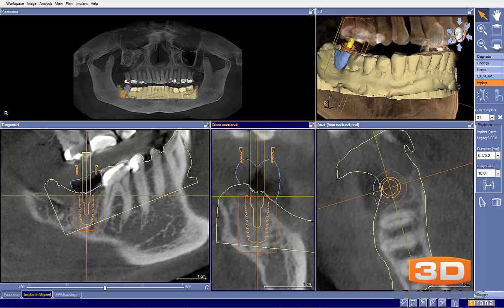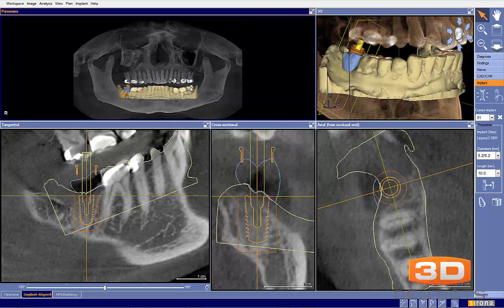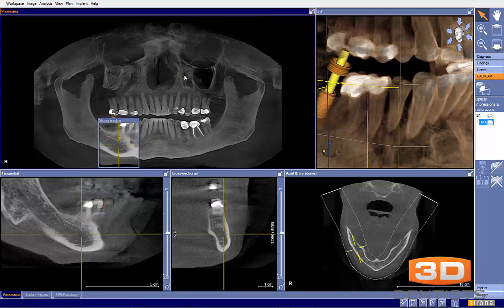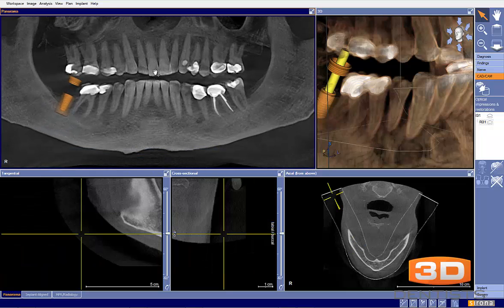I love getting these cases. They're always very helpful to everybody involved, and this is quite a common occurrence. Let's start over here from the beginning, and let's adjust and start back, and let's step in. What kind of guide should we be making here?